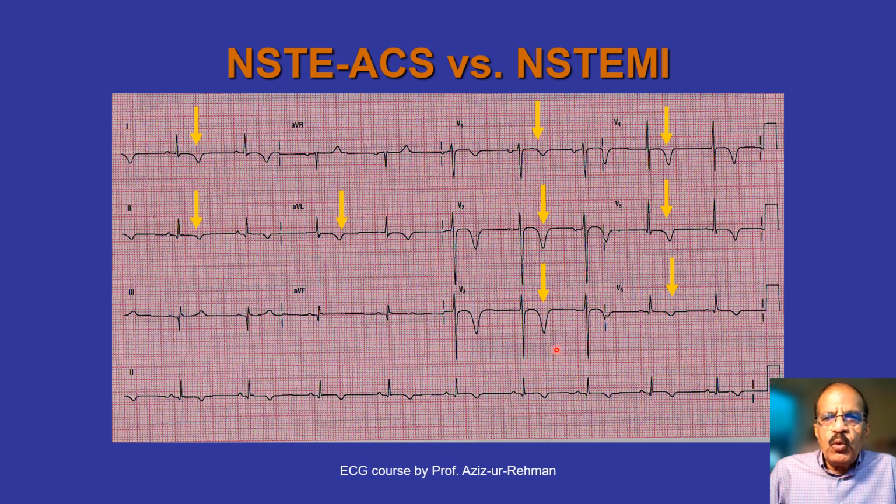At this stage, if you do not have troponins available, you should call it non-ST segment elevation acute coronary syndrome, because these changes are certainly reversible. Of course, ST segment elevation is also reversible. Q wave is generally not reversible, but T wave inversion is reversible. So you cannot say for sure if this is infarction unless you demonstrate that troponins are elevated, or over a period of several hours and days these changes persist. So in the proper context, this ECG should be interpreted as a sign of NSTEMI.